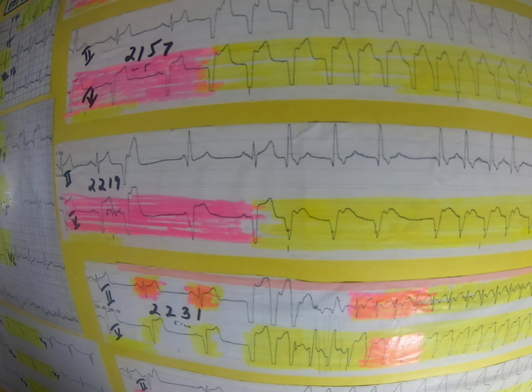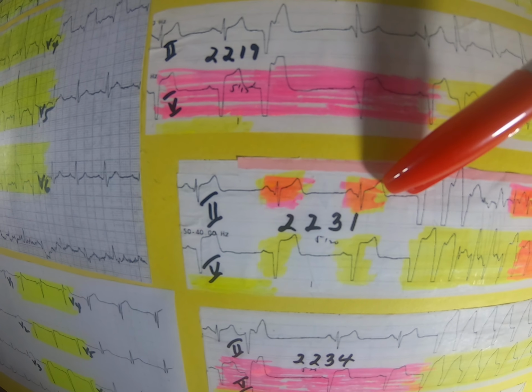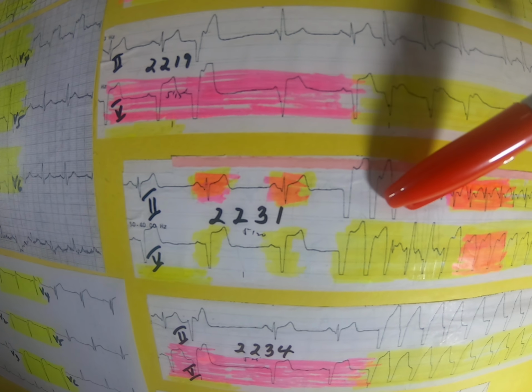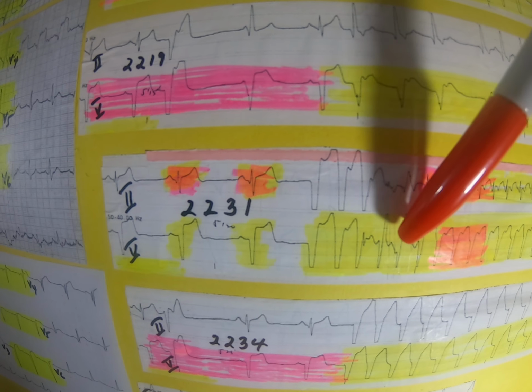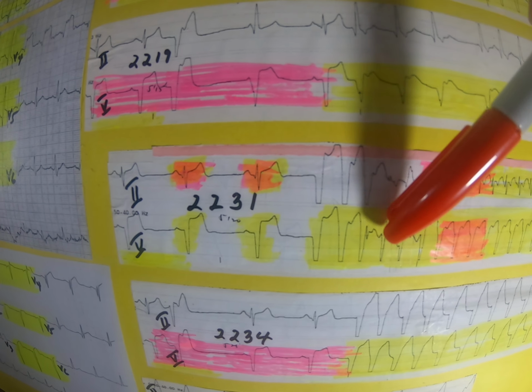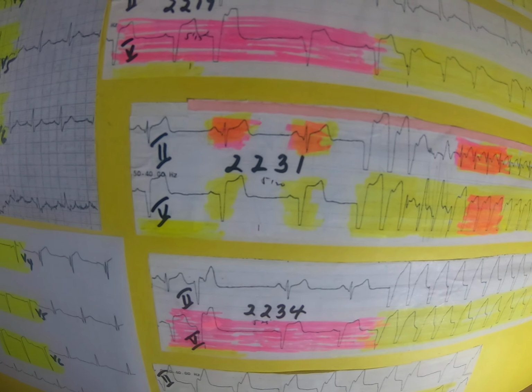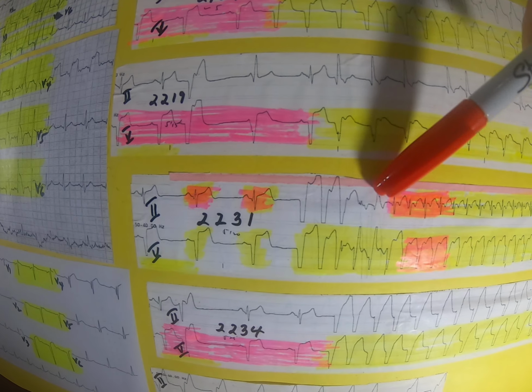Okay, here we go. We have narrow complexes here, and it's long. Okay, you see, we have here a QRS of the patient. This is sinus QRS in here. Okay, we have 3 ventricular beats, and we have 2 fusion beats. That is a hybrid. 2 stimuli. Okay, there are 2 things that happen here. The ventricular and the sinus, they stimulate both the ventricle. We have a fusion beat here.